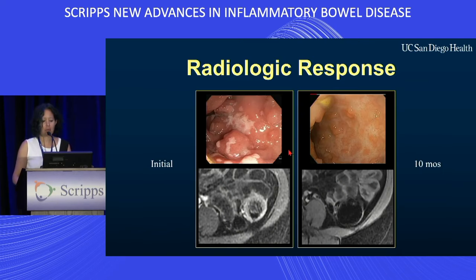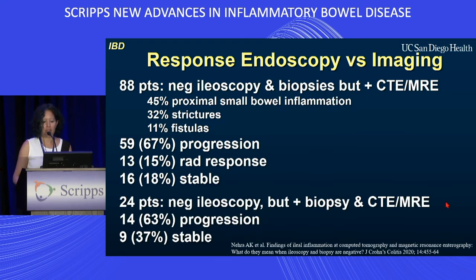And this is the sort of thing that we like to see. We like to see these things line up here, right? So endoscopic assessment here, lots of inflammation. We see that large, thickened segment of colon, a lot of inflammation enhancement associated with it. 10 months of treatment later, now we see that there is really flattening of a lot of that inflammation here in the colon, and the wall has also gotten a lot thinner here.